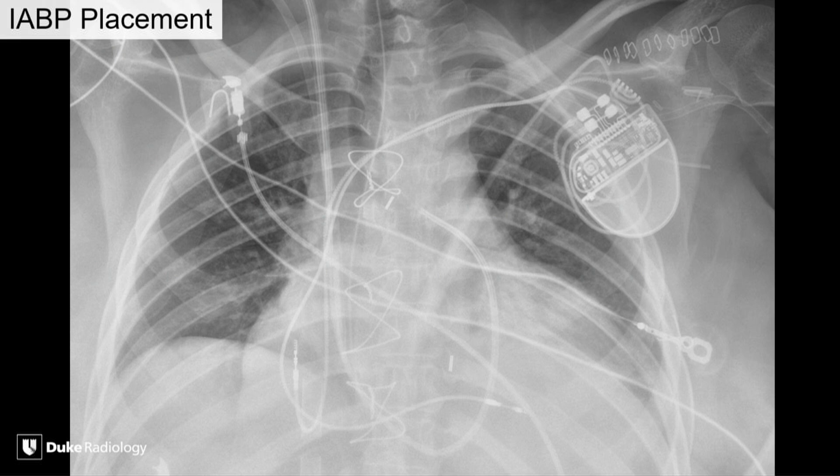So I'm going to start off with this. This was an IAB placement film, came down intra-aortic balloon pump, and so we're looking for the marker. I'm sure everybody has seen these. And so it looks like there's a marker there sort of over the midline, which is a bit of an unusual position. But as you look at the exam, you'll see another, identical looking marker here. So it looks like both balloon pump markers, and as I'll discuss in a minute, they often have markers at both ends of the balloon, projecting over the sort of midline of the chest. They're only about 8 centimeters apart here.